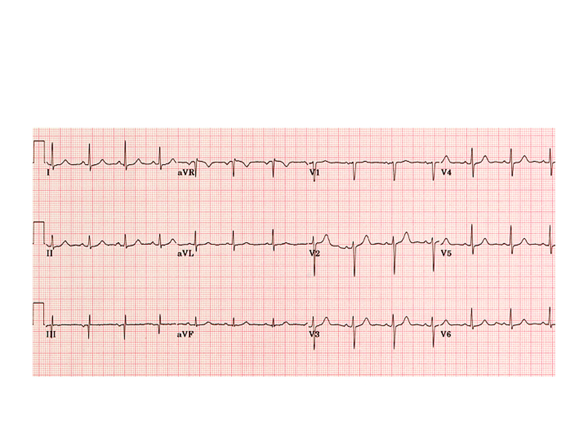Let's look at this example of a normal EKG. So if, for example, we look at lead 1, we see that the QRS is positive and the ST segment is upright as well. This follows in leads 2, AVL, AVF, and then in lead 3, which is isoelectric, actually the ST segment is flat. The leads that are negative, like AVR, also have flipped T waves.